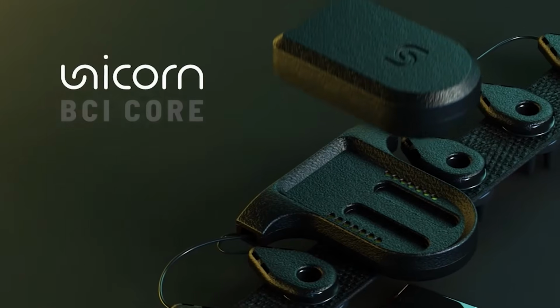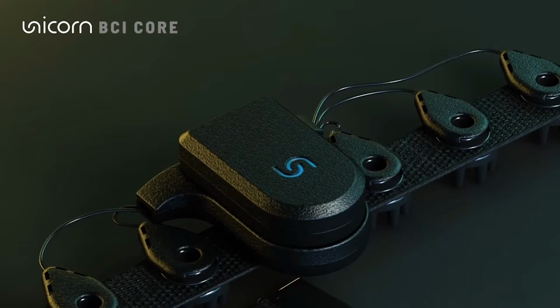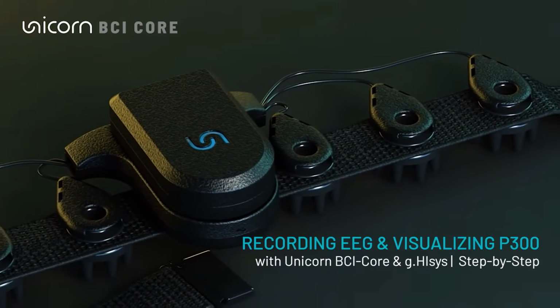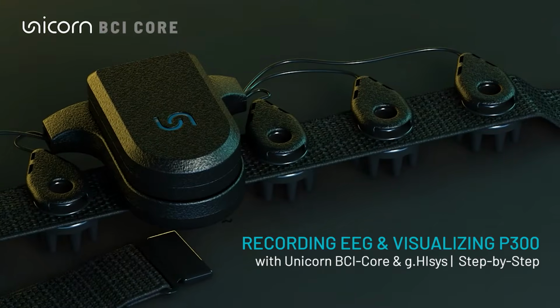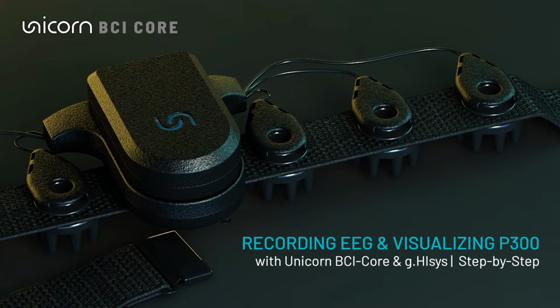In this video, we will show you how you can use the Unicorn BCI Recorder and a Unicorn BCI Core with 8 channels to record EEG and run a Visual P300 Oddball Paradigm. The event-related potentials we will then visualize in real time using g.HIsys.